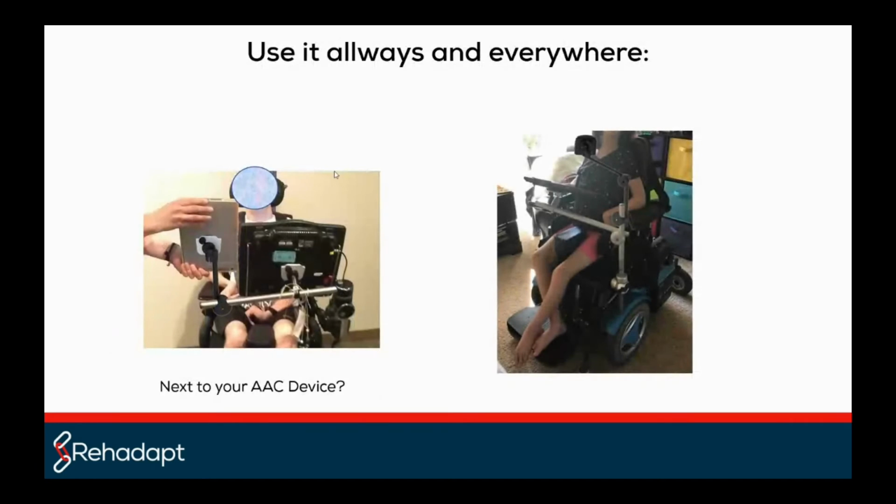So for these situations, when we want to use a tablet system, there are various options of mounting brackets that we provide for end customers, such as these heavyweight or heavy load M3D mounting brackets that can be installed to every wheelchair that is existing on the market.